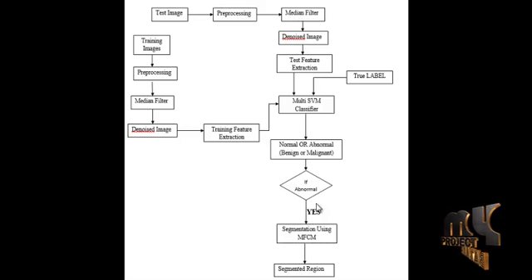And then modified FCM is used for segmentation. Clustering techniques can be seen as a data compression technique. In this, the dimensionality of the input image is reduced to a good extent. Here, a huge number of input samples is converted to a smaller number of representative clusters. FCM is the clustering technique that permits one pixel to belong to more than one cluster. This algorithm divides a collection of pixels into a collection of clusters according to some criteria.